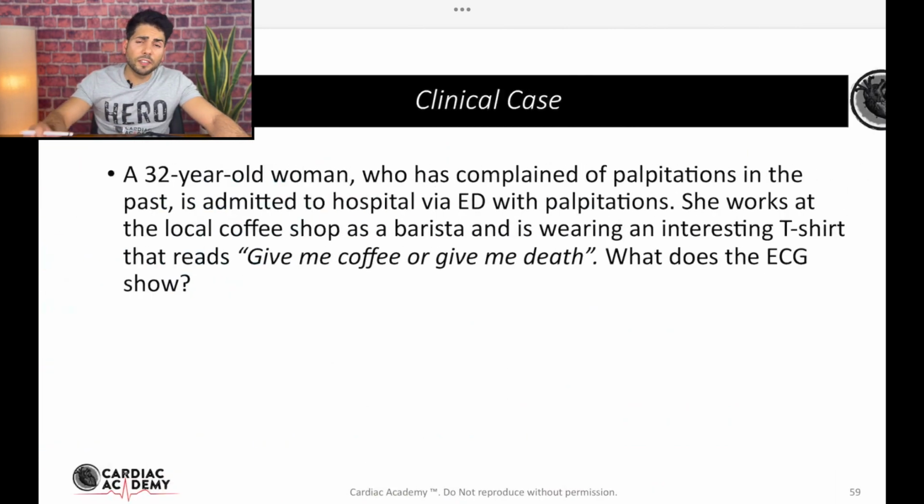All right, let's finish up strong by discussing a clinical case. So let's read it. A 32-year-old woman who has complained of palpitations in the past is admitted to the hospital via the ED with palpitations. She works at the local coffee shop as a barista and is wearing an interesting t-shirt that reads, "Give me coffee or give me death." What does the ECG show?